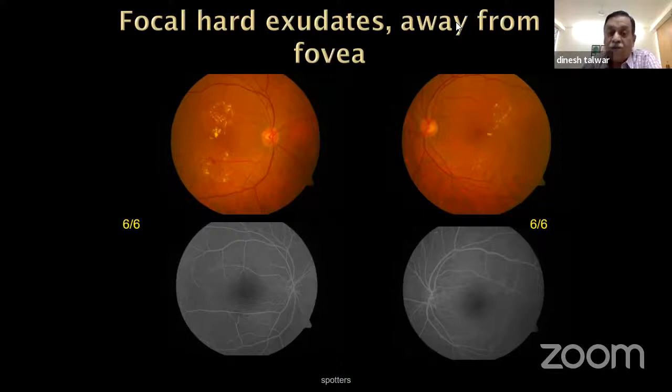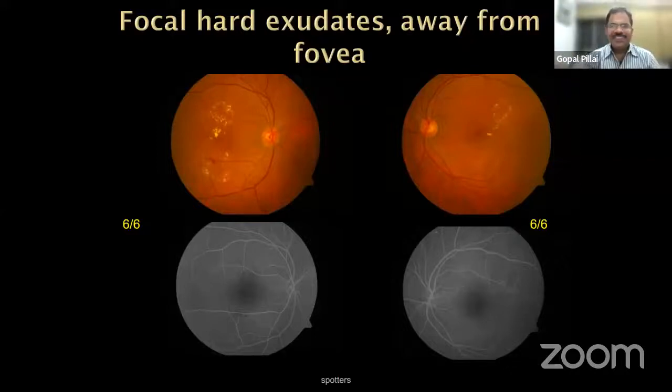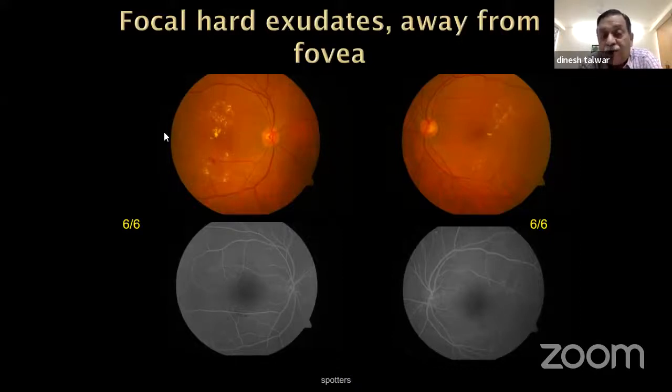See, he knows more than what he's showing you. So there's a difference here. So the question is, based on this photograph, was he trying to trick you into something? That I always do, no? Yeah. So it's a little tricky. So you have to say, in the photograph, can you see any evidence of severe NPDR? Anybody? Can you actually define severe NPDR based on this single photograph?